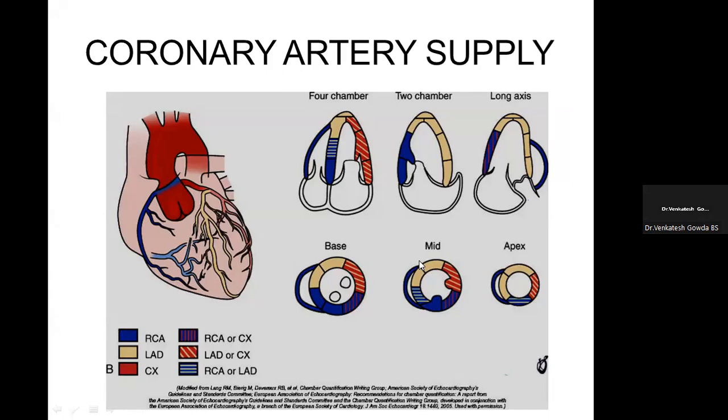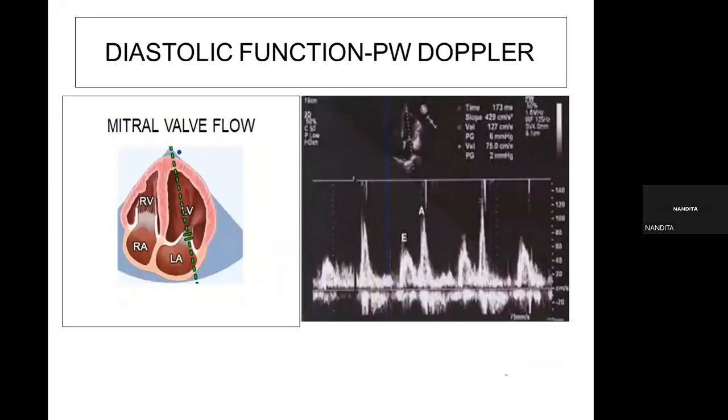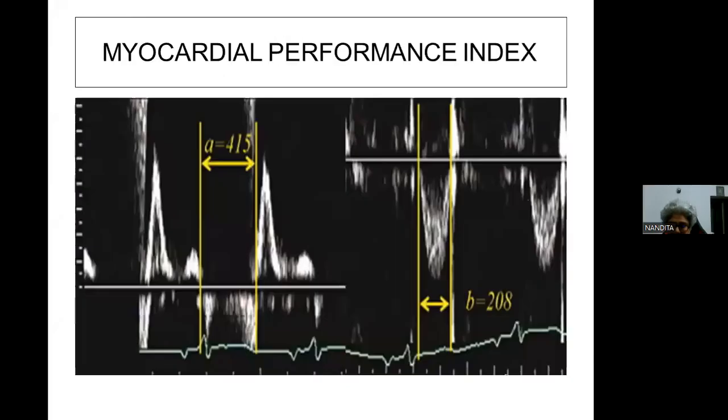Madam, this leading edge and trailing edge will be helpful in measuring the septum. Other than that, where will it help? No, I didn't get your question. What linear? Leading edge and trailing edge, madam. Oh, it will be leading edge and trailing edge.